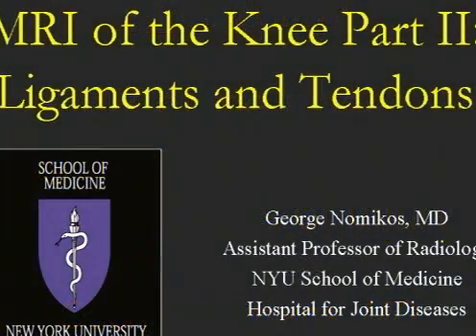All right, so those of you who made it through the first hour, congratulations. This second hour on the knee is going to be talking mostly about ligamentous injury, patterns of injury, and again, it's going to be very heavy on anatomy.